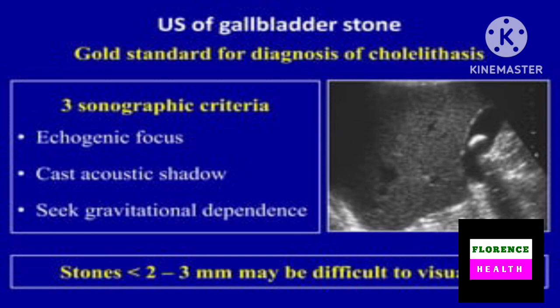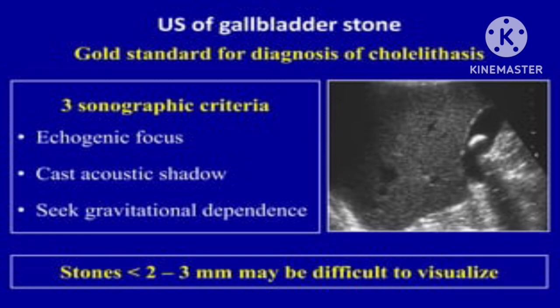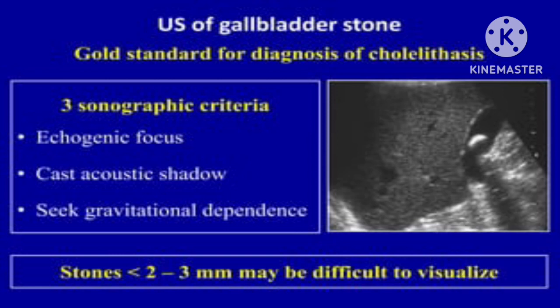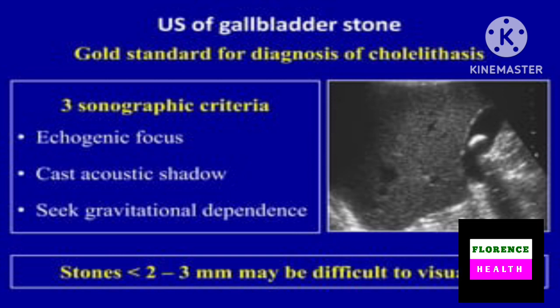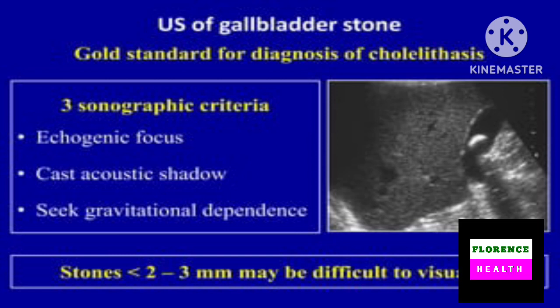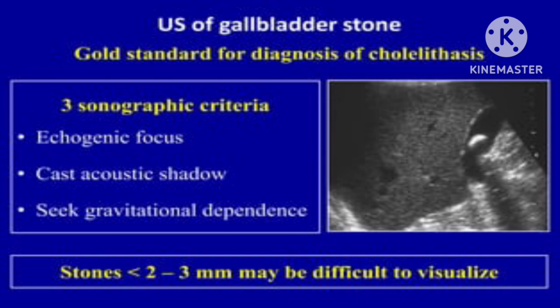Remember one important thing: stone less than 2 to 3 mm may be difficult to visualize on ultrasound. I am telling again, stone less than 2 to 3 mm is difficult to visualize on ultrasound.